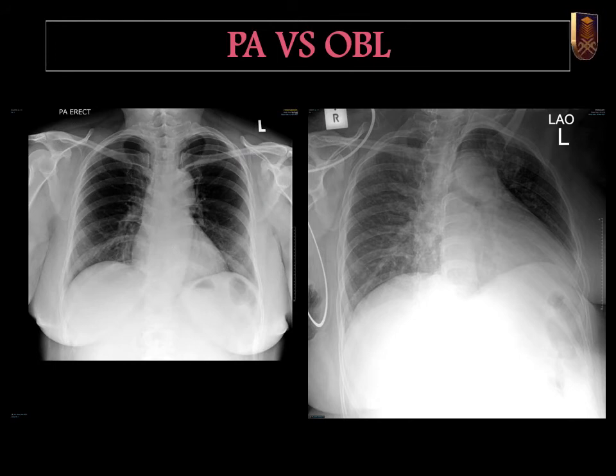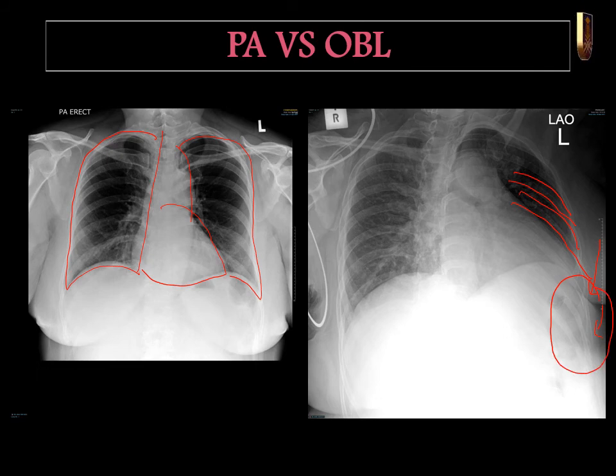As a radiographer, one should be able to differentiate between the PA and oblique projection of the thoracic cage. As you can see, oblique projection focuses more on the depiction of the anterior and axillary rib contour instead of the lung and heart. The delineation of the rib contour helps the radiologist to identify any presence of fracture that will lead to lung or heart injury.